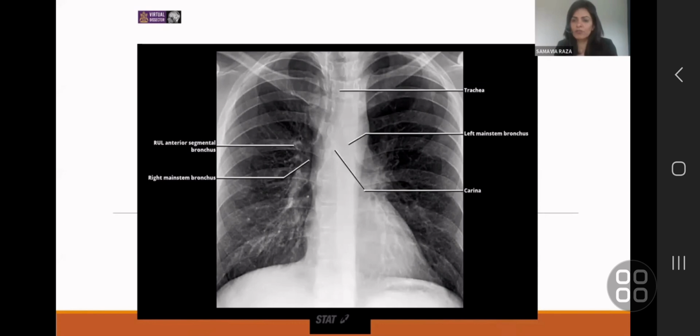Most of the time you're not going to notice the trachea. On chest radiograph, the only time realistically you're looking at airways is when you're looking for a foreign body. On the airways on a front radiograph, you don't have size estimates. The size estimates are on CT and MR. So don't be put off with the absolute values.